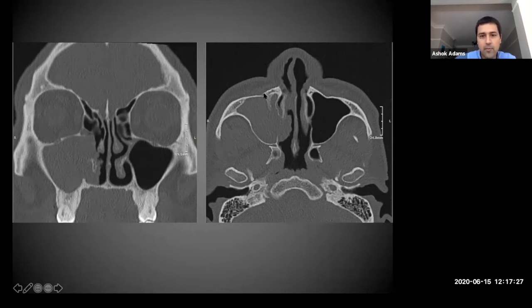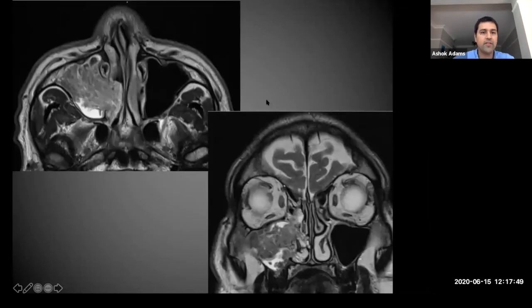Similarly here, the patient's got a unilateral right-sided maxillary sinus opacification. Going to look at the bones, and here the surrounding bones are actually intact, but you've got a little bony outgrowth here. So as a guide for some of you, when you've got unilateral opacification, this little bony outpouching raises the suspicion that there's an inverted papilloma. We did the MRI in this patient, and you can see this cerebriform appearance. That was an inverted papilloma, and that was the kind of bony attachment that you can sometimes see with these tumors.